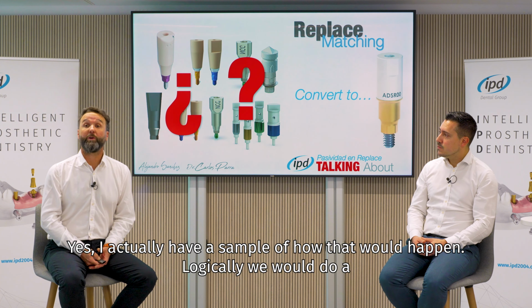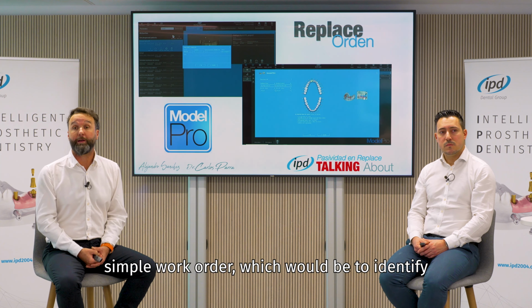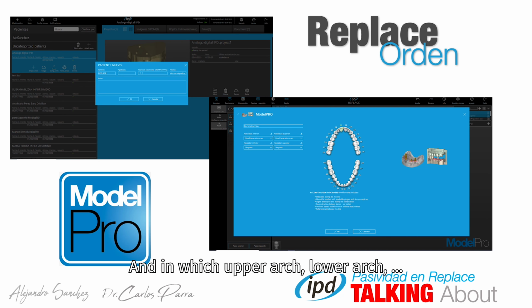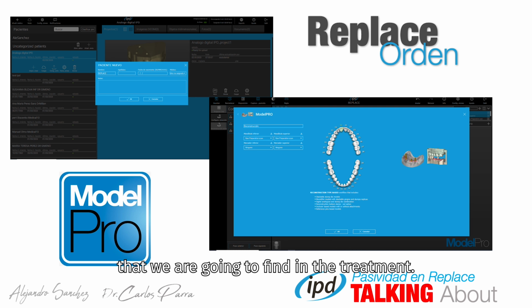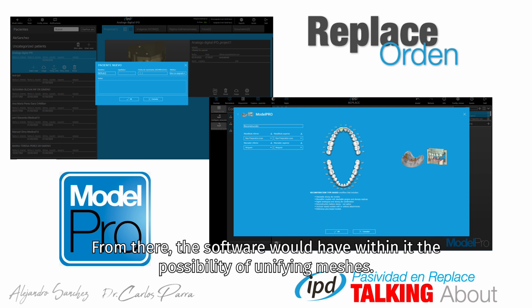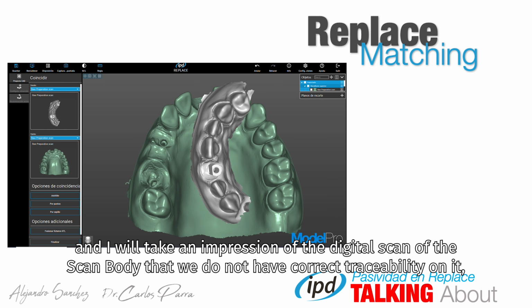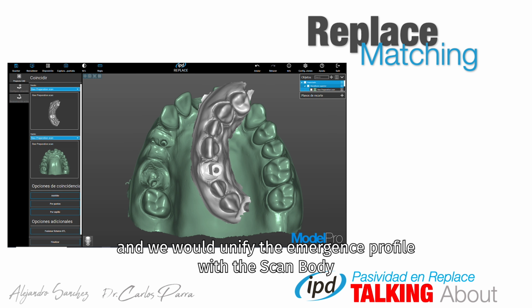Yes, I actually have a sample of how that would happen. Logically, we would do a simple work order, which would identify which pieces are going to carry the digital markers in this case, and in which upper arch, lower arch. In other words, to provide the software with the information about the scan body situation that we are going to find in the treatment. From there, the software would have the possibility of unifying meshes. If you take an impression of the emergence profile, and I take a digital scan of the scan body for which we do not have correct traceability, we would do a matching, a best fit, and we would unify the emergence profile with the scan body.